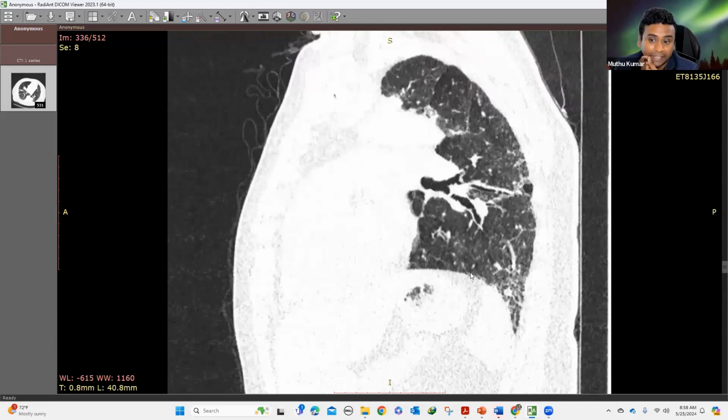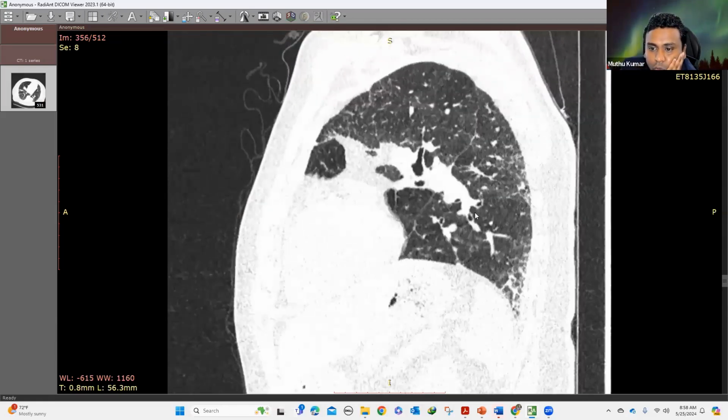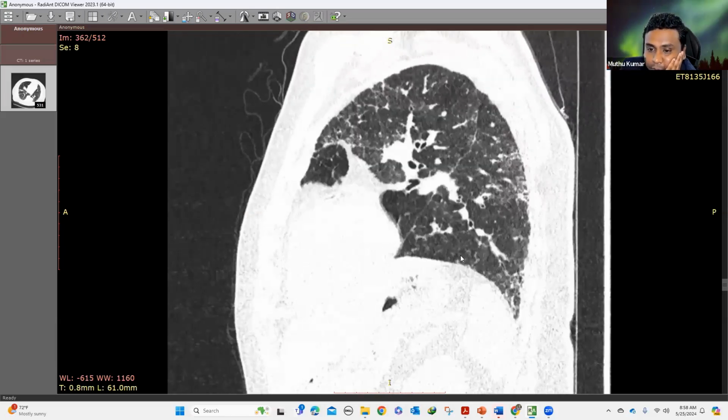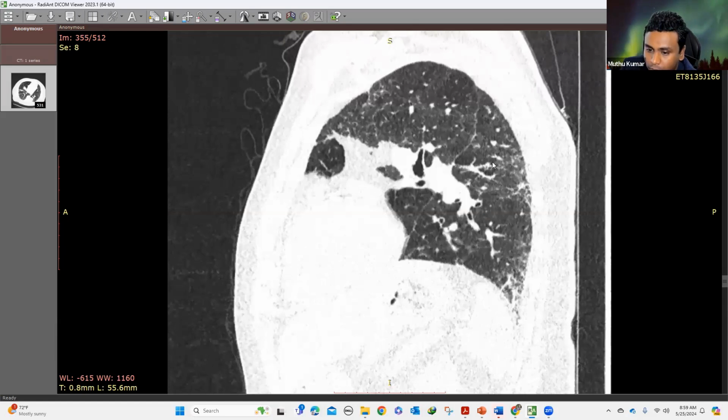This is what I look at when there is presence or absence of fibrosis. So what happens in ILD related fibrosis is you can see the fissure. The fissure is undulating. You can see it is not as smooth as a straight line. When I see that, that is a first evidence of architectural distortion. Okay, that implies there is some kind of fibrosis is happening and there is evidence of volume loss.